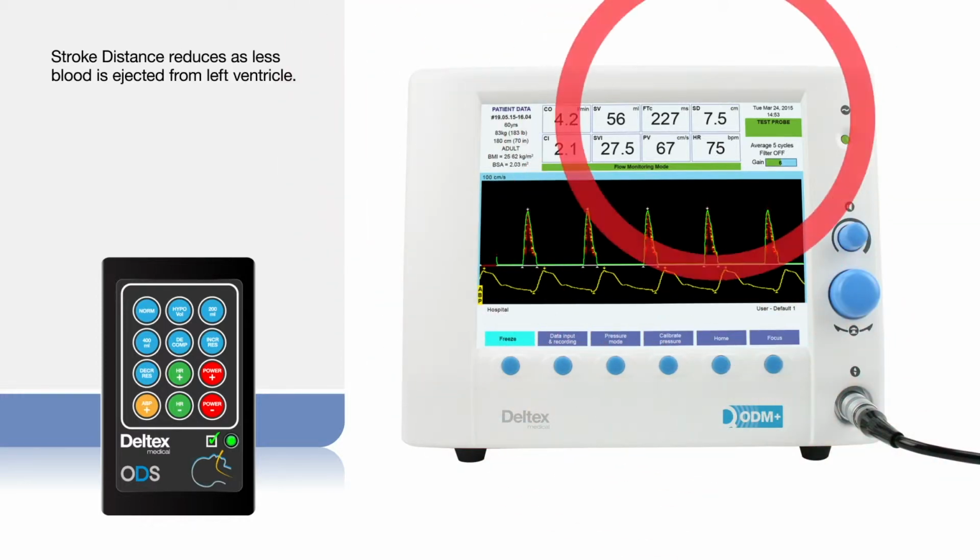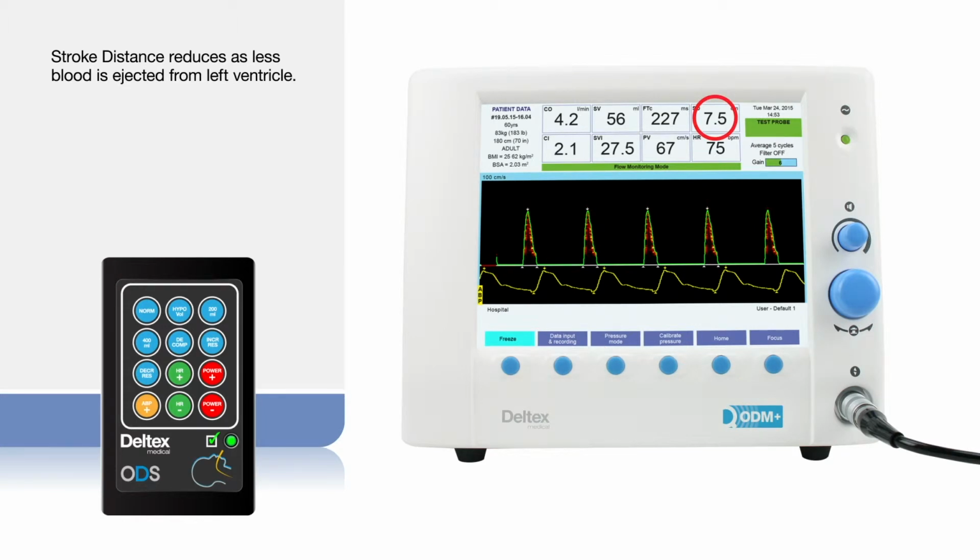The direct measurement of stroke distance has fallen because of the smaller amount of blood ejected from the left ventricle. Stroke volume has reduced accordingly, showing a fall of more than 40 millilitres per heartbeat. In patients, these parameter changes will be specific to the individual.